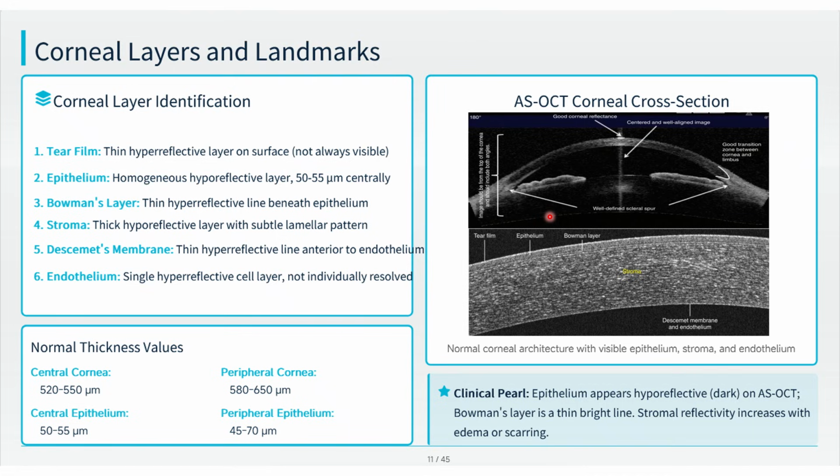And this is one mild drawback of the anterior segment OCT, that it cannot determine the details of the ciliary body as compared to the UBM, that's the ultrasound biomicroscopy, in which we can see the details of the ciliary body. So by just looking at this picture, you know that this is an OCT and not a UBM, because only the central part of the lens is visible. So this is hyperreflectivity from the lens in the central part only. So this is an OCT map.